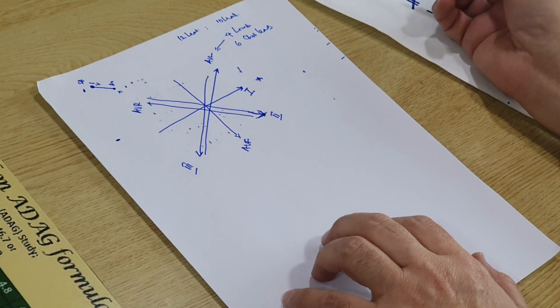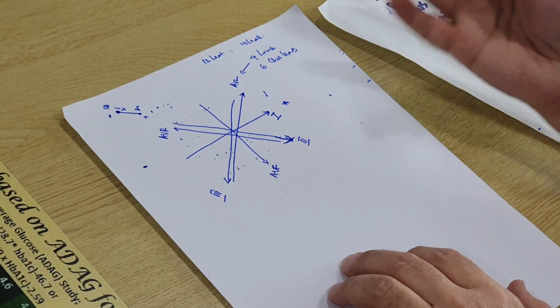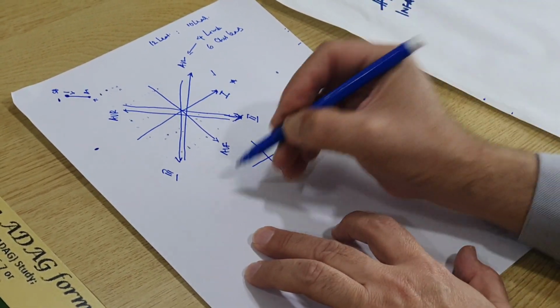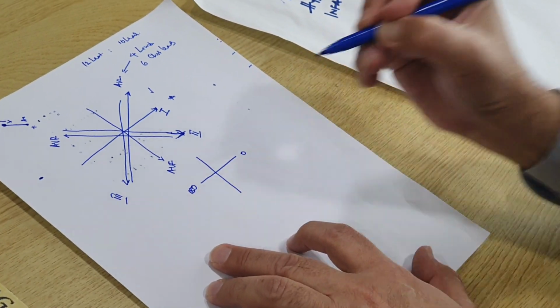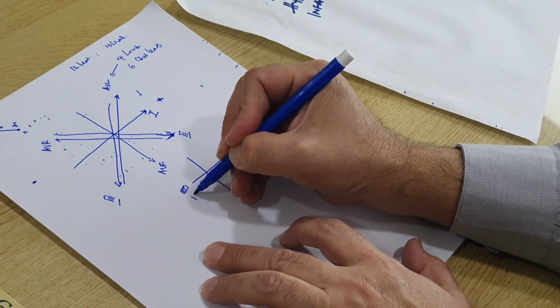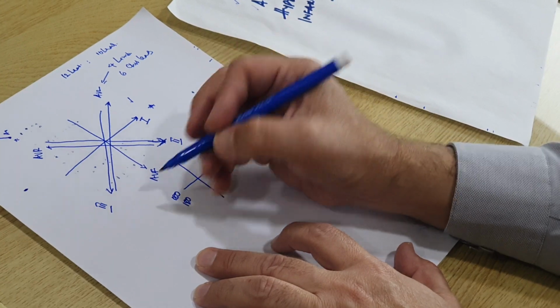The normal cardiac axis means that the normal flow of current is like this. This is 180, this is 0, and this has 2 signs to it. This is a positive and negative 180.